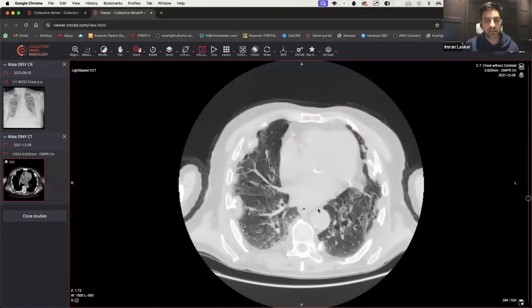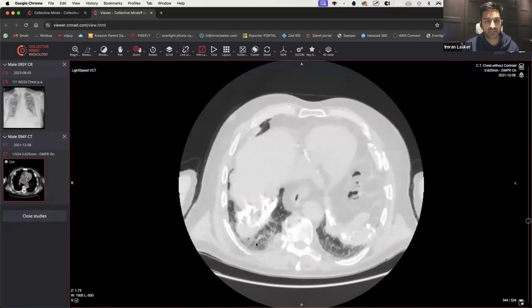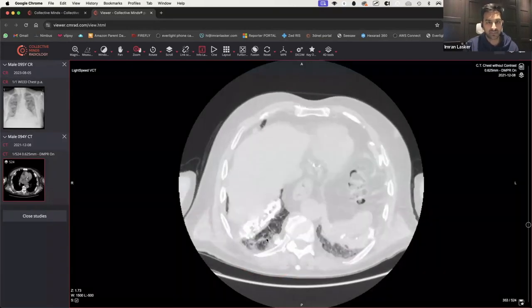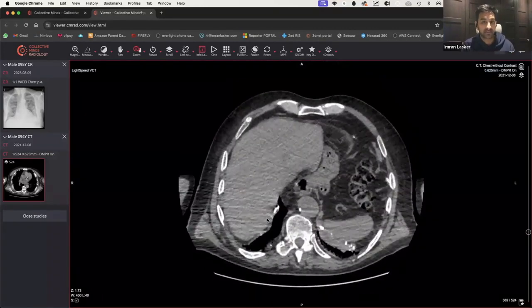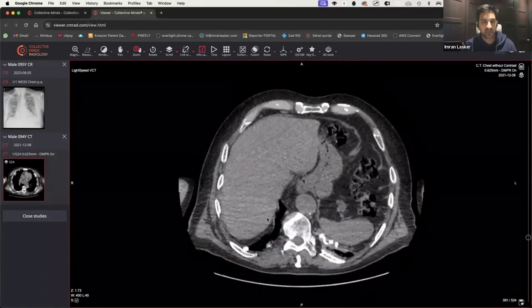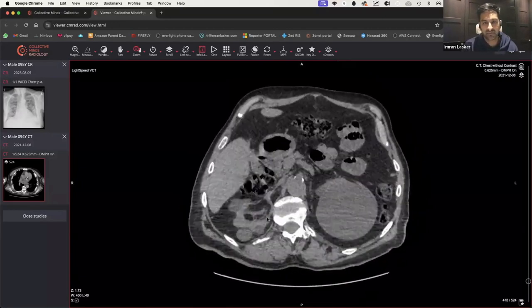And then we were concerned there could be some consolidative changes located within the right lower lobe. And I think there could be. Can you see there? It just starts to look a little bit more hazy, a little bit less well-defined around that pleural plaque. There could be. The reason I put it up was just to show you what pleural plaques look like, and like I said, there are varying abilities that come to these talks, and yeah, fair enough, maybe simple.